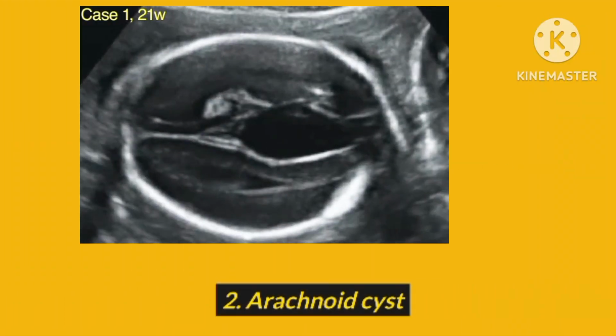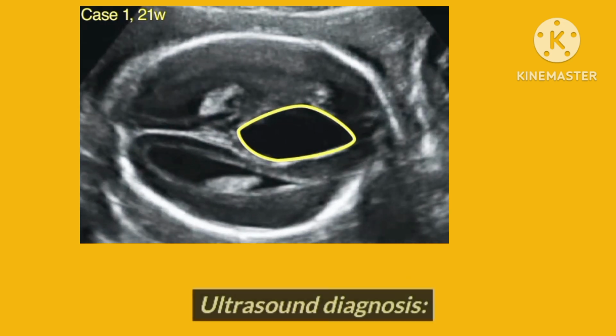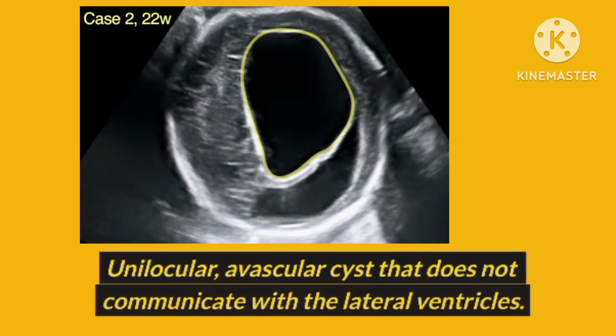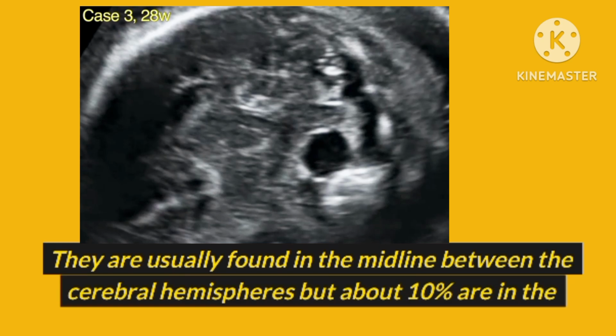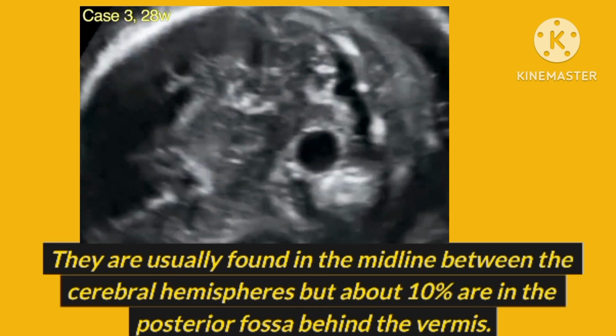Number 2. Arachnoid cyst. Ultrasound diagnosis. Unilocular, avascular cyst that does not communicate with the lateral ventricles. They are usually found in the midline between the cerebral hemispheres, but about 10% are in the posterior fossa behind the vermis.